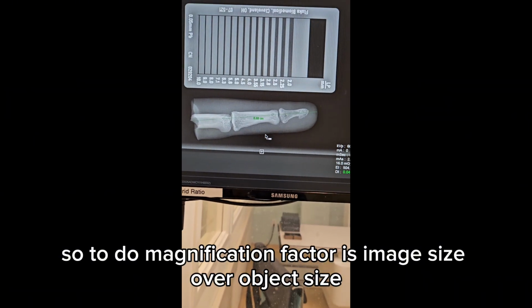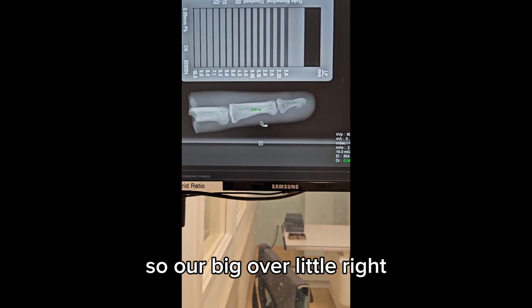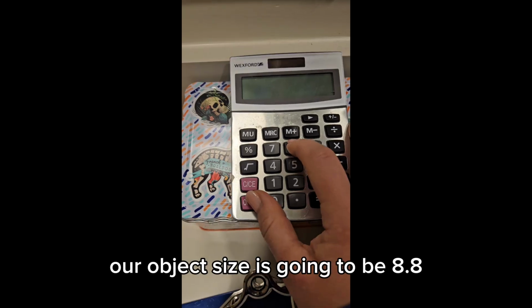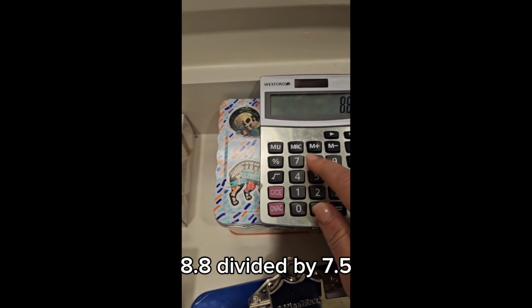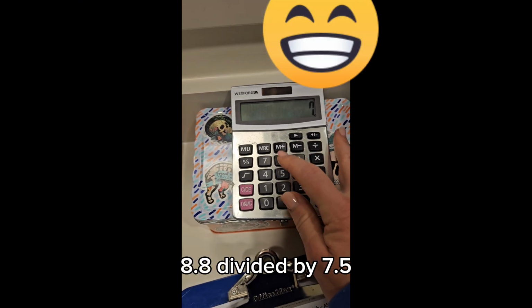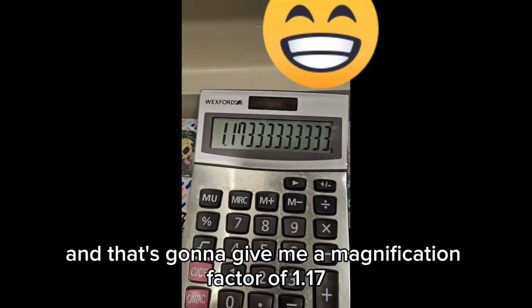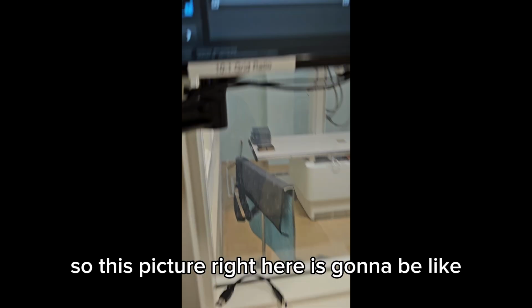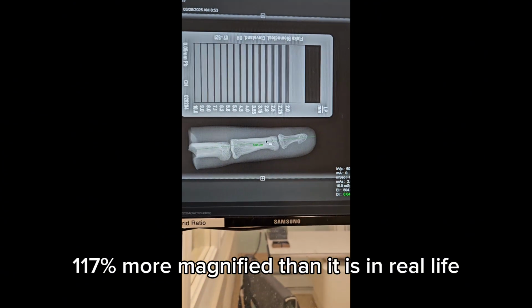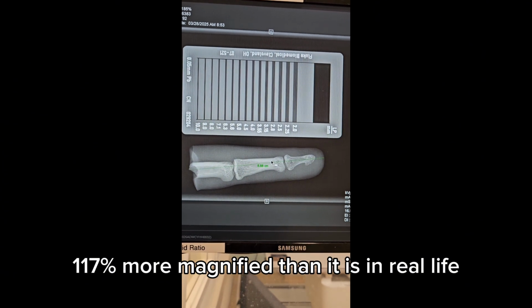So now we have to do our magnification factor. To do magnification factor, it's image size over object size. So our big over little, right? Our image size is going to be 8.8 divided by 7.5. And that's going to give me a magnification factor of 1.17. So this picture right here is going to be like 117% more magnified than it is in real life.